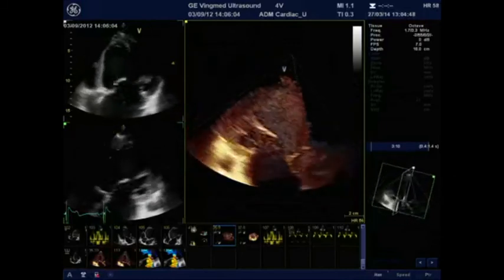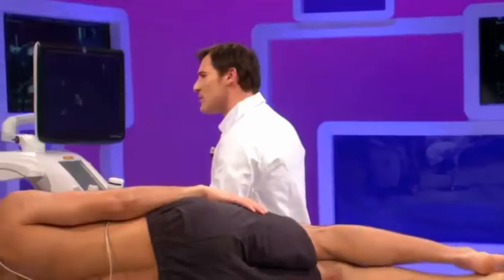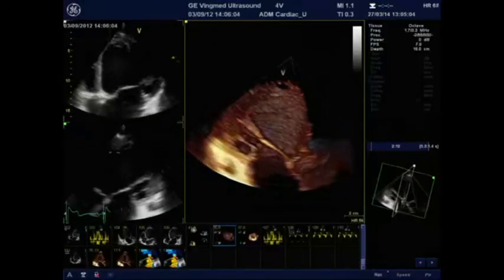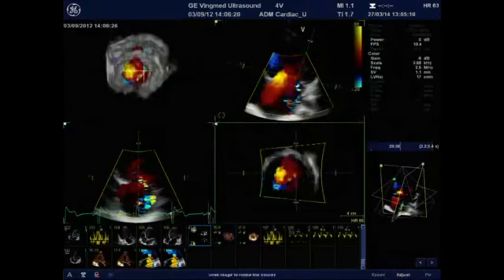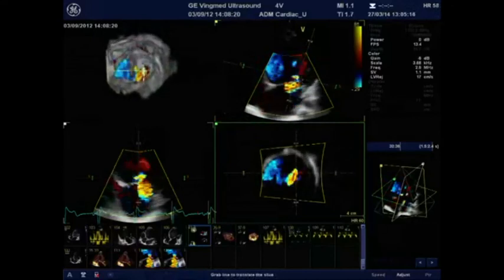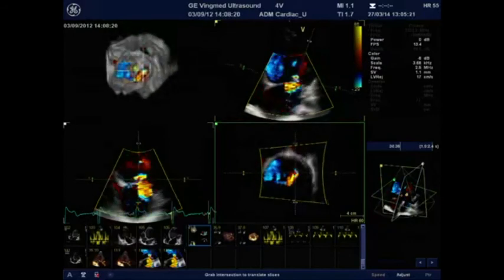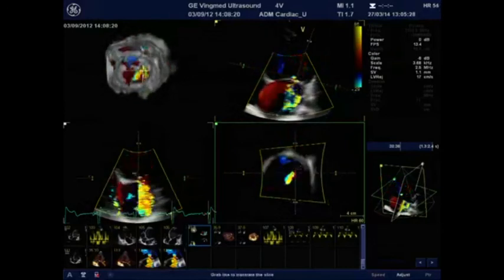Now, maybe to illustrate a bit what I said regarding the regurgitant flow across the regurgitant orifice and the geometry of the regurgitant orifice, let me take 3D images with color flow Doppler. Here you have different views, for sure sections, and you can crop here just to be sure that you are in line at the level of the regurgitant orifice. And if we are exactly located at the level of the regurgitant orifice, there is something very strange here.